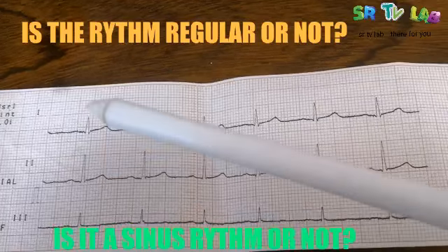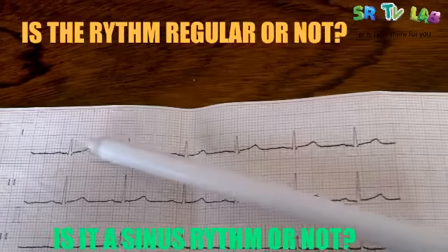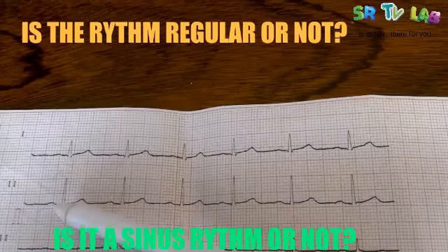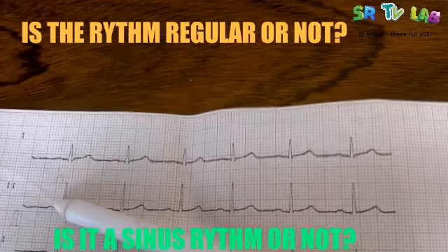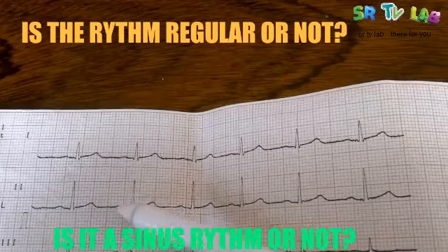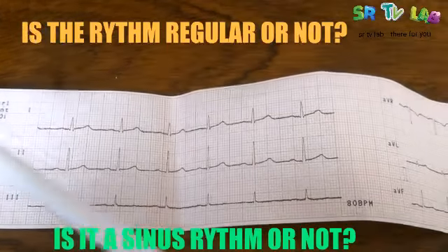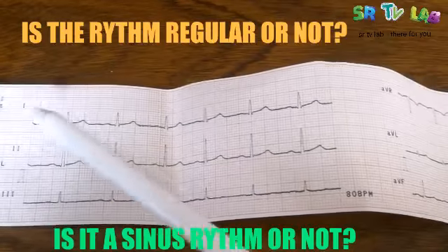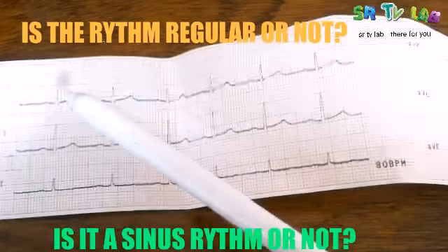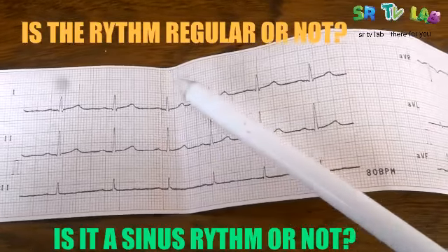At every lead, you have to check if there is an R wave. This prominent part, the one that deviates upward, is the R wave. And before the R wave, we find the P wave. Here we found a P wave. Here there is another P wave. Good, we are checking the rhythm to see if it is regular or irregular. In order to find out, you have to check the interval between 2 adjacent R waves. These are the R waves.